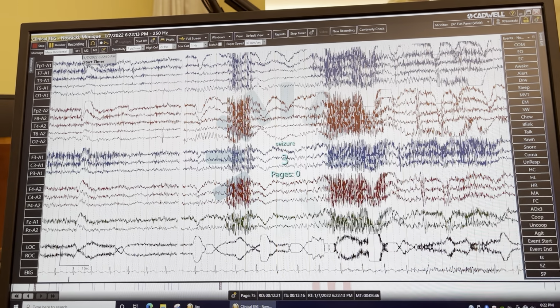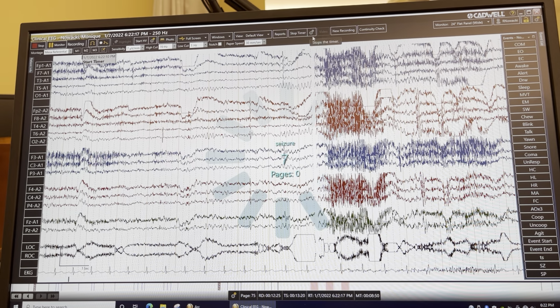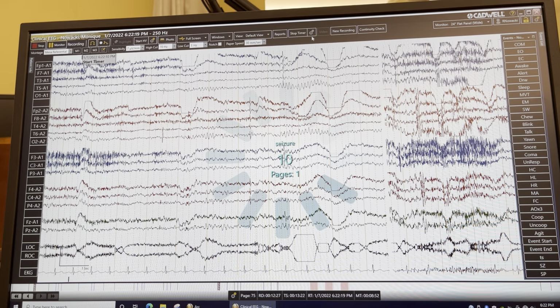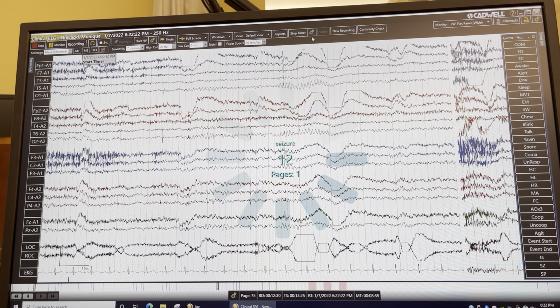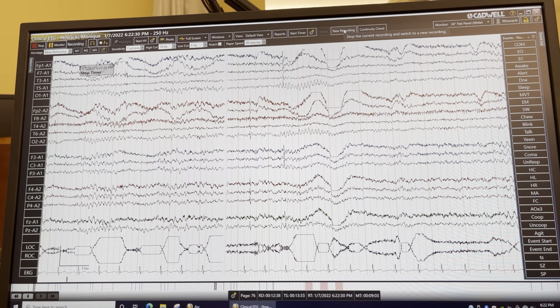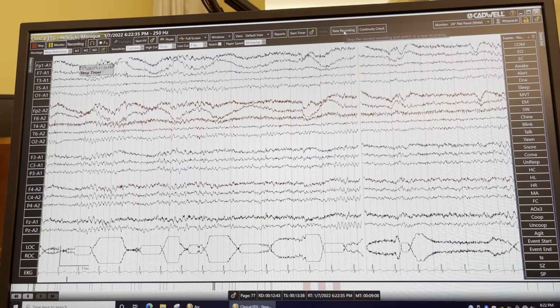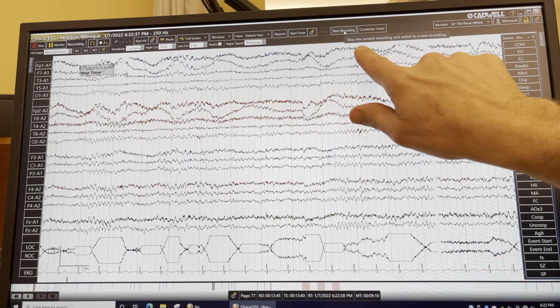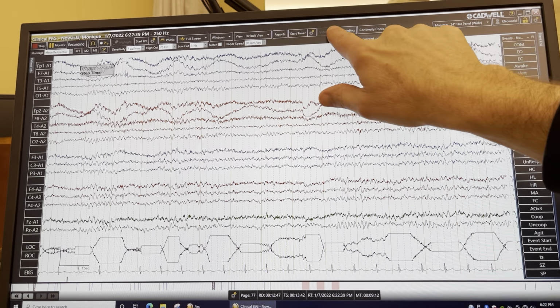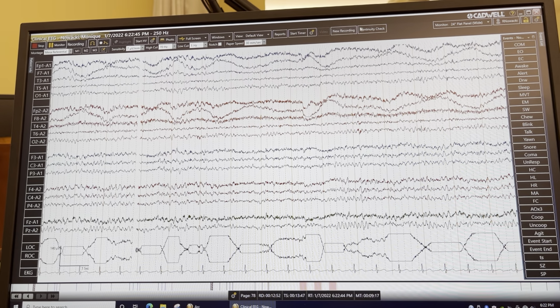I don't know what that is. I guess I shut it off. If you want to start a new recording, let's see. It says stop the current recording and switch to a new recording. So if you want to end this study and start a new one, you just click on that.